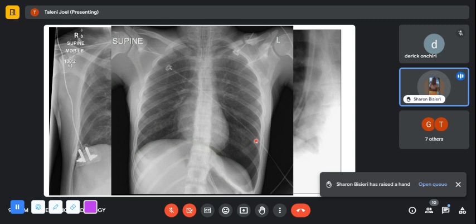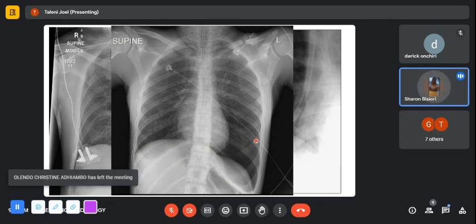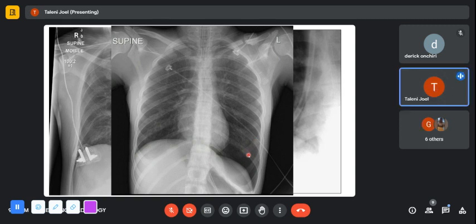Just a clarification, because the left hemidiaphragm looks almost similar to what I remember us seeing in a subpulmonary effusion. So could you please illustrate again the double diaphragm sign on this so that I can see if I can differentiate the two? There's no double diaphragm sign with the... She's saying effusion, the diaphragm looks like subpulmonic. So show her the two aspects of the diaphragm.